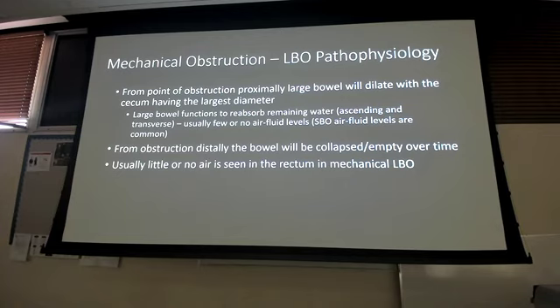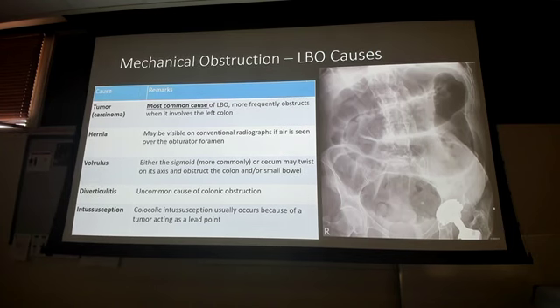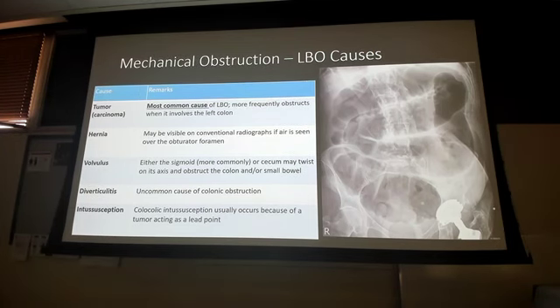If I don't, possibly large bowel. Plus, when you look at my large bowel, where are all of my many, many lines that come all the way across? I'm showing you what you're looking for. I don't have them. What I do have is some haustra here, here, kind of coming across a little bit, but not all the way across, and they're pretty well spaced out, okay? So that's how you can tell large bowel versus small.